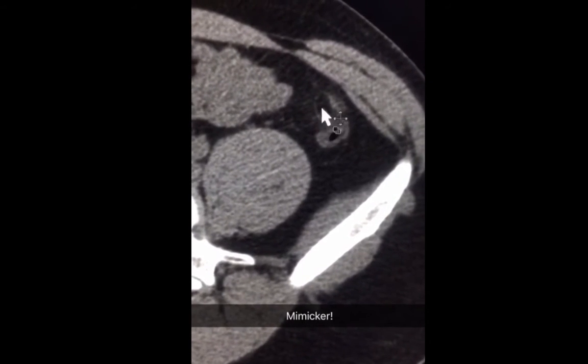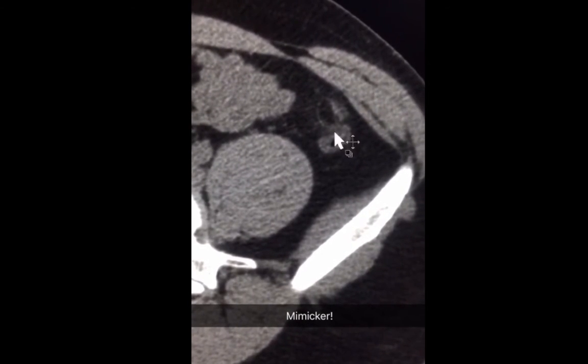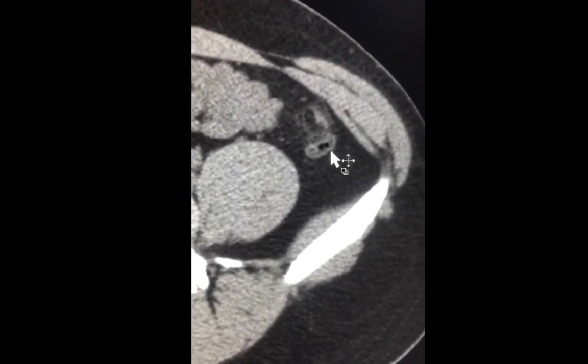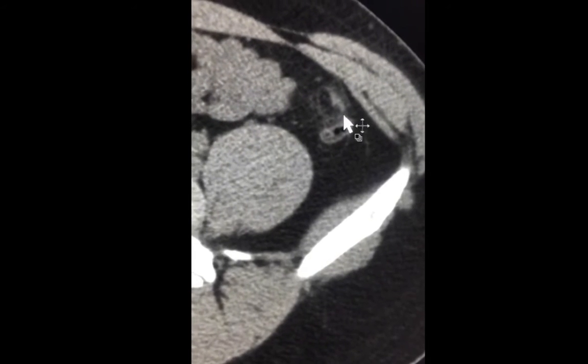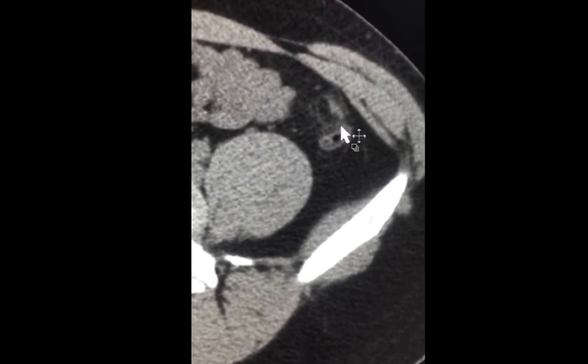That's why if this happens on the left side, it could mimic diverticulitis, and on the right side, it could mimic appendicitis. This is good news to the patient. This diagnosis is not a surgical diagnosis. The treatment is observation and painkillers. This entity of epiploic appendagitis typically resolves spontaneously within a short duration.